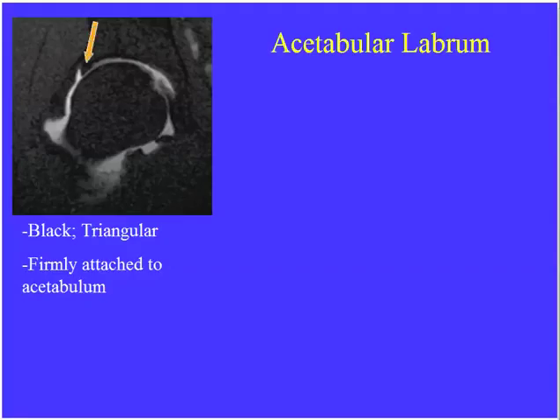Now, the acetabular labrum abnormalities that you may see, you need to know the normal appearance of the acetabular labrum, and this is best evaluated in the coronal T2 plane.